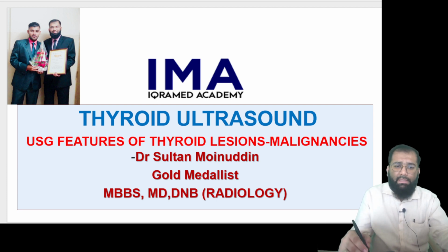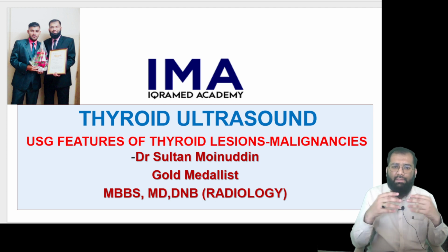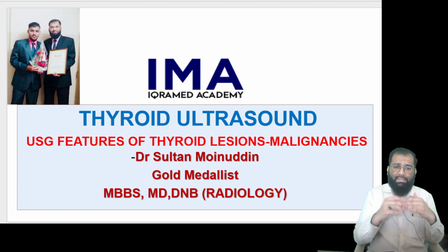So in this session, I'll be discussing the ultrasound features of thyroid lesions, especially malignancies. This is my second successive session on ultrasound features of malignancies. Before this, we have discussed TI-RADS. We have got three sessions on TI-RADS.